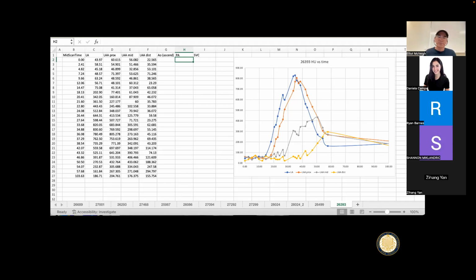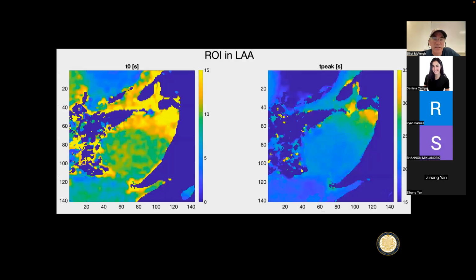And I have only one patient here, but we have like 30 of these now. And the variability in this function is quite high, depending on the geometry of the left atrial appendage, on the patient's function, etc. I'm feeling this is much more valuable data than the CHA2DS2-VASc score in determining whether or not somebody should have anticoagulant therapy. But that is yet to be proven.